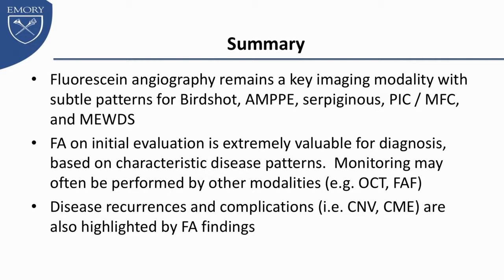And again, these disease recurrences and complications can be highlighted by FA findings. And so it still remains a valuable tool for the white dot syndromes.